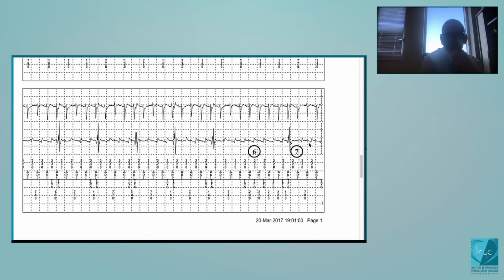Okay. The lead may have moved also. You implant the leads, then it moves. And if the lead has moved and it's at the limit between the atrium and the ventricle, you may find these kind of situations. But most of the time in this situation, the amplitude of the R wave is very variable, the lead that's moved. Here in this situation, the lead is placed just after the tricuspid and the R wave is stable.